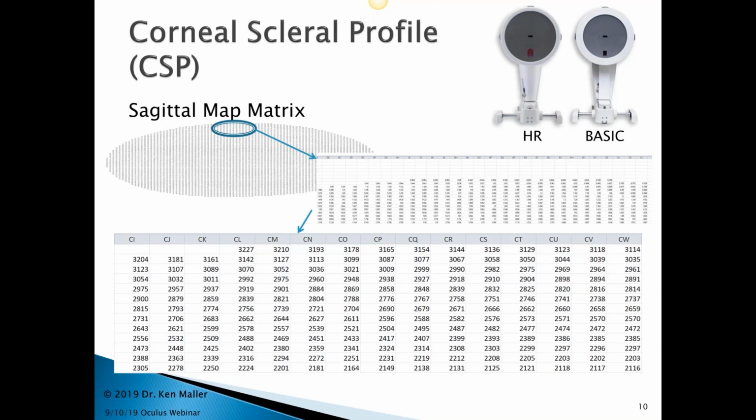They're being captured by the CSP software, and then output into this particular matrix. I find that this information is considerably more valuable because it doesn't get you mired down in minutia, and it also gives you a sense of the trends rather than any instantaneous specific point.